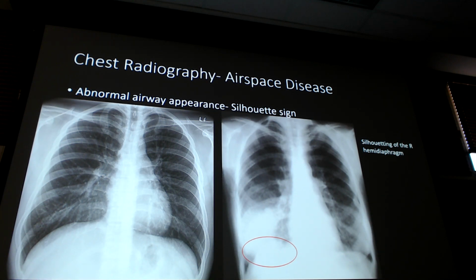and all you can get is that AP chest x-ray? I can't get a lateral. You can't do laterals portable. We don't have the technology to make them a good image. It just is fuzzy, nasty. You can't make anything out. So you only get the one frontal view. And you start to see a silhouette sign. You're like, I think I have pneumonia. I think I have some kind of consolidation or some abnormality.